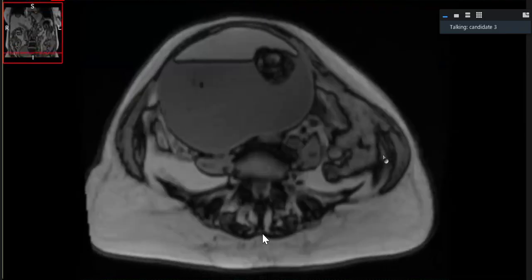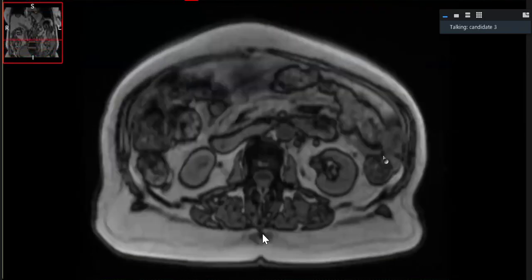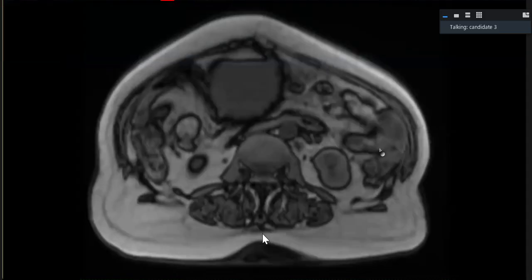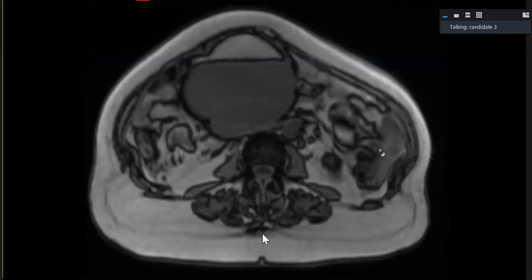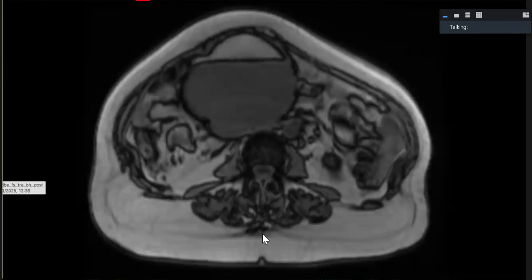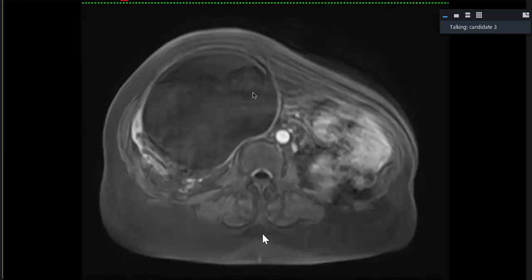Yes. So in my routine practice, I will review patient's previous record for any known pelvic mass lesion in past. Considering the presence of large size and fatty component, I am concerned about malignant transformation in germ cells in some old dermoid cyst or a primary malignant ovarian mass. So I'm also concerned about the nodularity of peritoneal outline, for which I will look at the post-contrast study to rule out any peritoneal metastatic disease. And regarding the solid areas, the enhancement features of the solid areas.